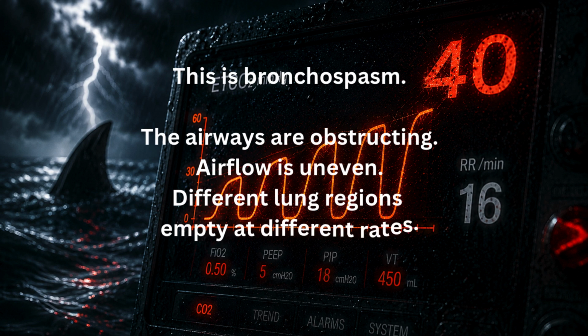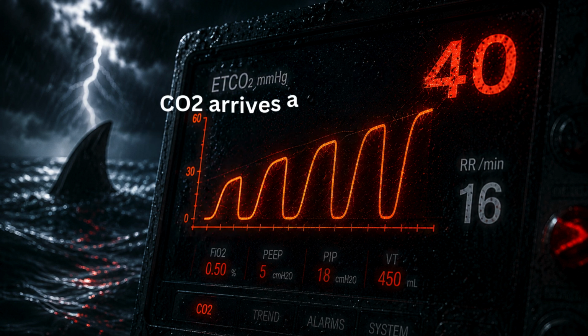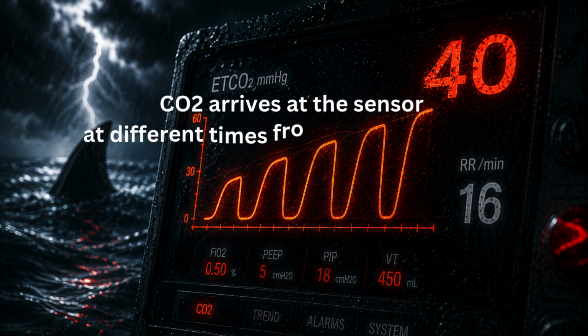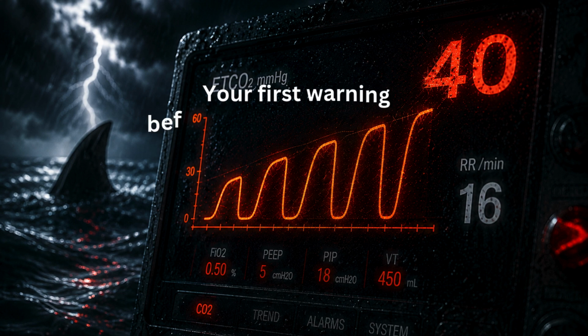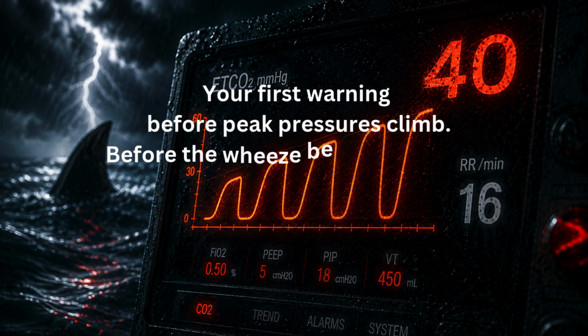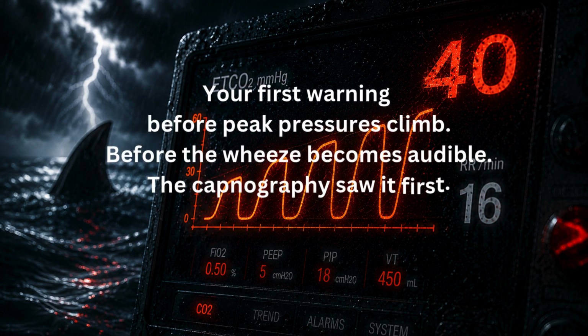Airflow is uneven. Different lung regions empty at different rates. CO2 arrives at the sensor at different times from different alveoli. The plateau can't form. It rises instead. Your first warning before peak pressures climb, before the wheeze becomes audible.